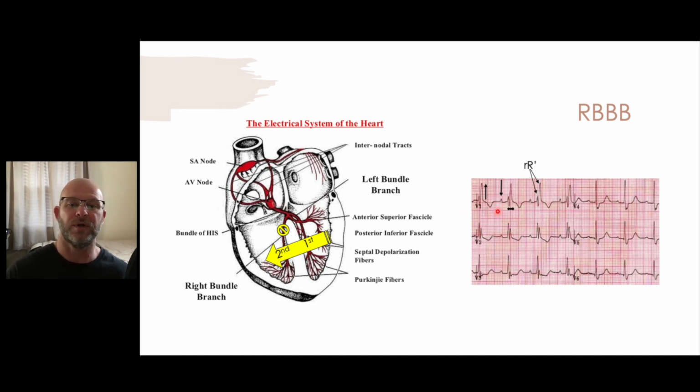That's why we want to see a P wave, or even a fib, something saying that, hey, this signal was coming from the atria into the ventricles. It was on the wiring at some point. That's what the P wave means. So as far as your conduction goes, we have a P wave, so we know we're starting in the SA node. The PR interval is less than 200 milliseconds, so we know that the wiring in the atria is okay.